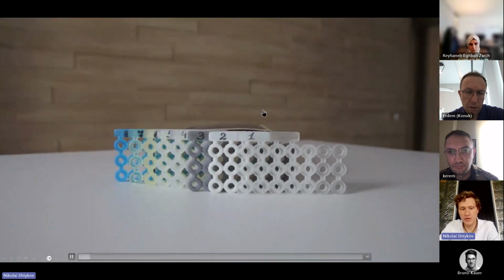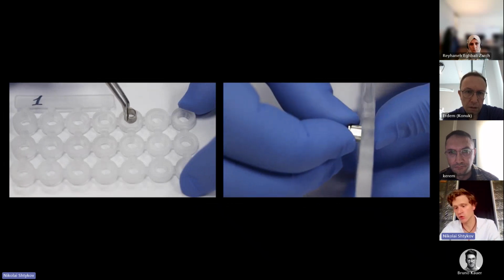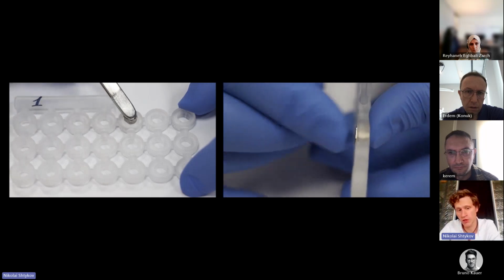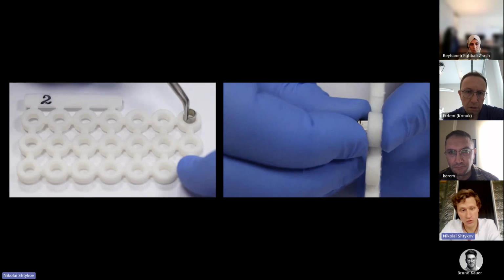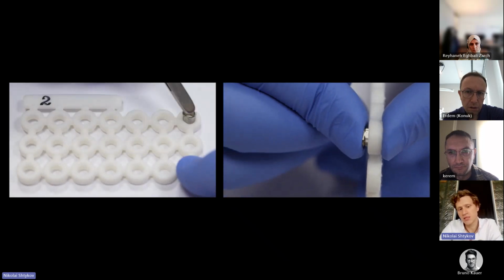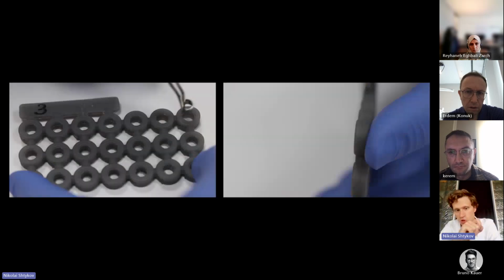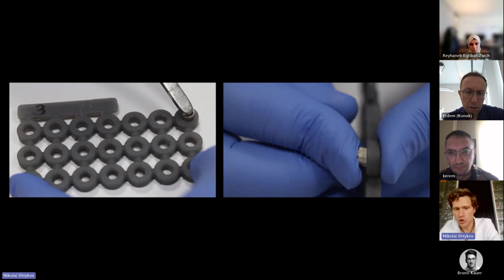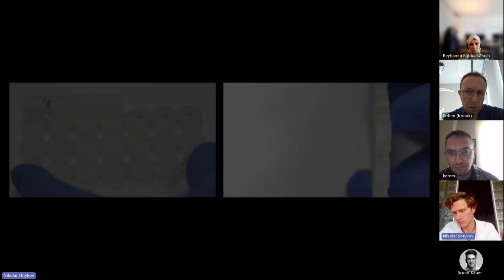And here is the video, a short experiment on how we printed this calibration matrix in different labs. We sent it to different labs, our KOL sent it to different labs, and then recorded this video. This right upper hole is the biggest hole, and each lab has two small surgical guides.